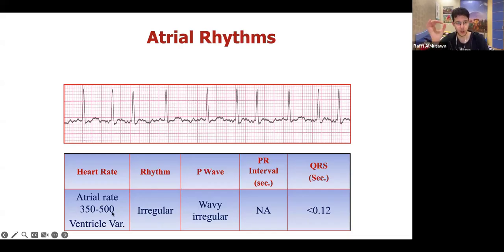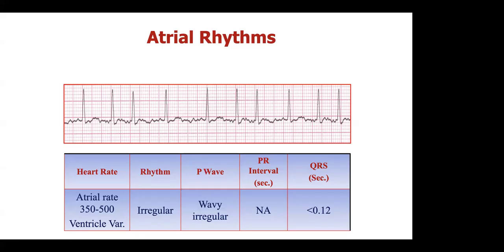And the reason is it's contracting, but the ECG isn't even picking up on all the contractions, because the heart is literally just fibrillating. Fibrillation sounds like what it means, which is honestly pretty interesting. As you see, it's irregular, and these don't look really like saw teeth. They look like what fibrillation would mean, because that's literally what fibrillation means.